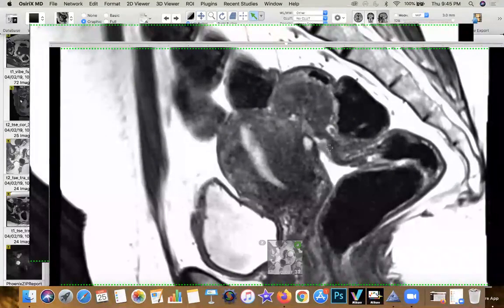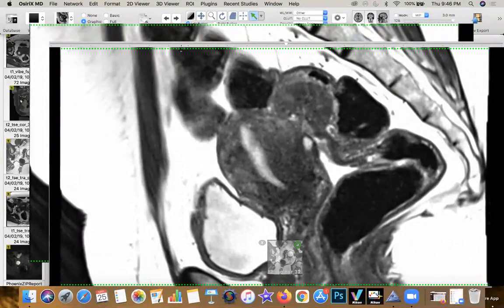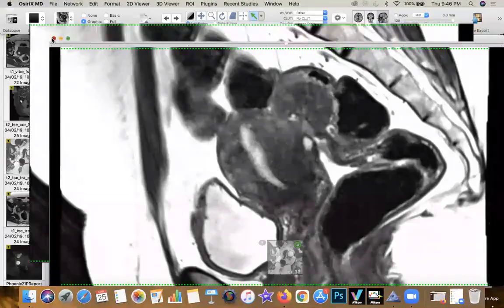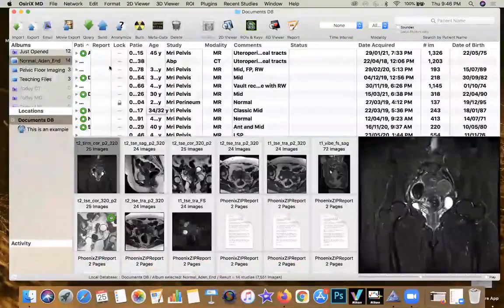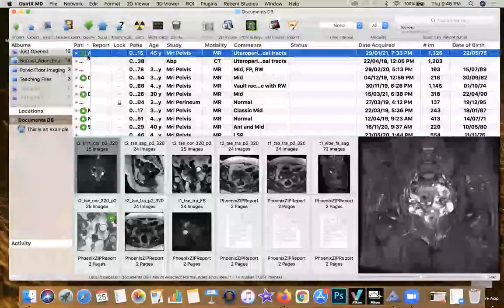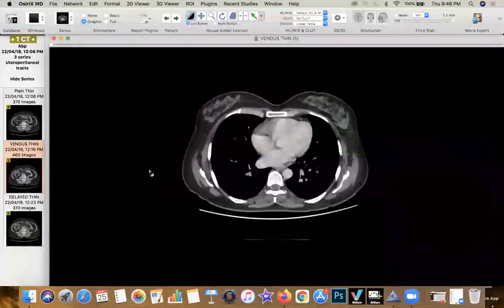Or the same thing can happen for pathologies of the uterus, where the rectal pathology may be secondary to something happening in the uterine corpus or on the surface of the uterine corpus itself. So why I've shown you this case is, this is how a classic clinical case works in your routine day-to-day practice. I'll show you another case which came to us very similar in terms of presentation.